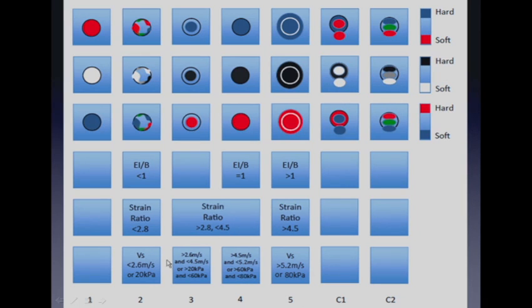If we look at the shear wave imaging, again, there are different methods of looking at this information. But if we look at all of the papers, let's use kilopascals here, and I give you the meters per second here also. Every paper that had a lesion of less than 20 kilopascals has shown that those were benign lesions, so we're going to give that a 2.